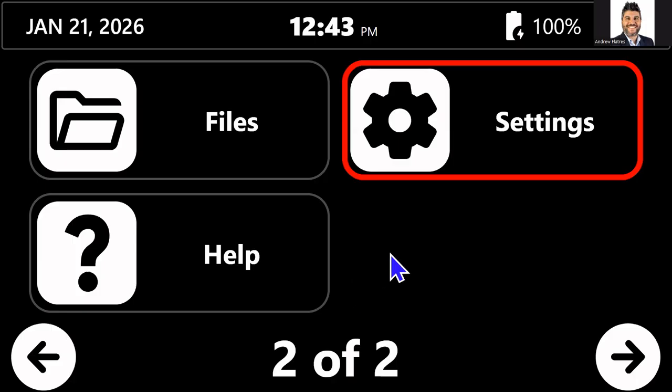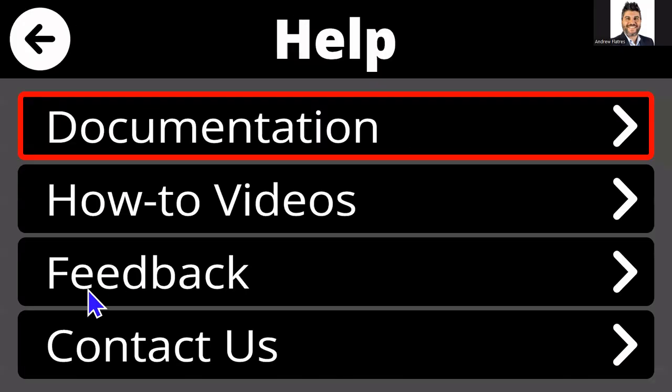So I have covered a lot of what's new there. There's a few other things under the hood. Within your files, when you update, there will be release notes, version 1.5, that will tell you all of what's new. But you can also go to the help application here, which I wanted to highlight a couple of things.